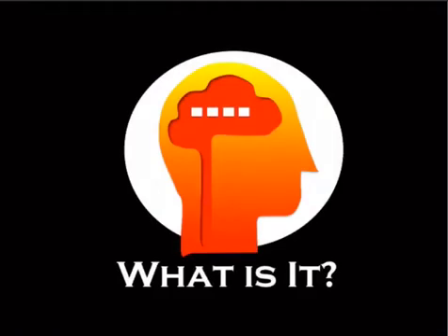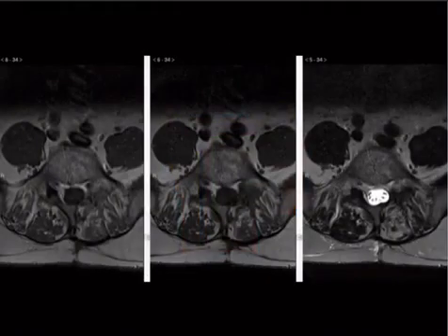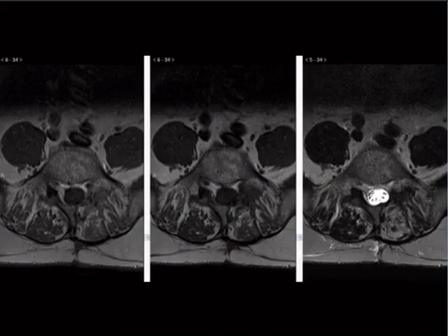All right, next case. So we've got 3 different MR sequences here. Let's name these if we can. CSF is bright, so that's a T2. CSF is dark, so these are T1s. And looks like there's some stuff enhancing here, so this is a post-contrast. Now, how do I know that he's had surgery? What I like to do is look back here at the skin. See that little thing right there? It's like the scar from the incision.